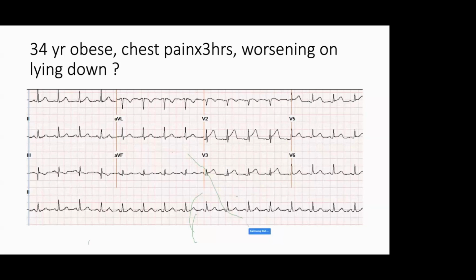The same findings I told you. There is a loss of QRS height, and there is an S wave. In V4 we can clearly see the S wave being pulled up by the evolving ST elevation, and the T wave is bigger, almost equal to that of the QRS. So it's a hyperacute T, wide based, and there is formation of Q wave, and there is corresponding reciprocal depression changes in the inferior leads.